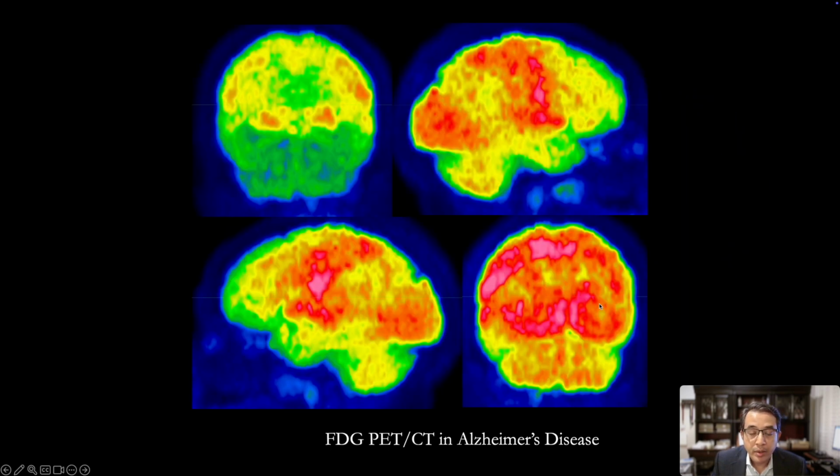So here on a different color scale, what I've done is taken snapshots in the anterior, right lateral, left lateral, and posterior projections. So let's start with the anterior. There is bilateral frontal hypometabolism. Like I said, this is seen in late stages of Alzheimer's disease, and through that hypometabolism, we are able to see symmetric uptake in the subcortical nuclei, which is normal.